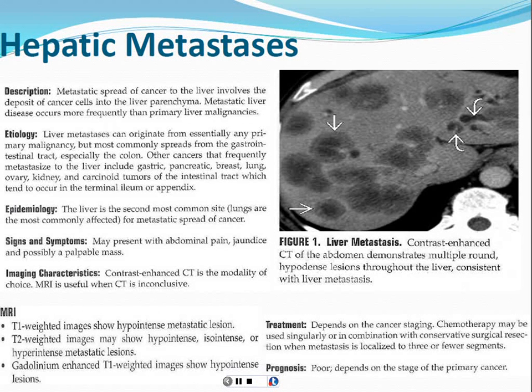This, on the other hand, you can see how these lesions, this is once again a CT, these lesions are also low density, but they're a little bit more heterogeneous. You see that the edges are a little less well defined. If you measured a Hounsfield unit value in this, you would not get a fluid attenuation level. And there's some other worrying findings that you're seeing here.